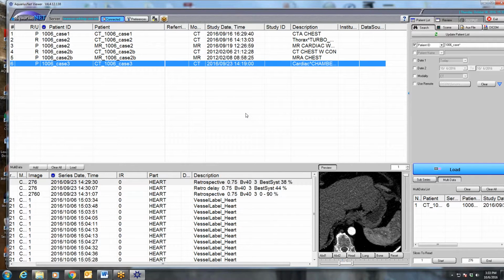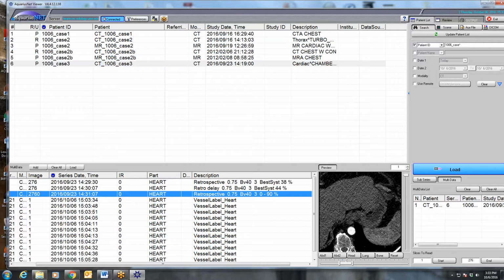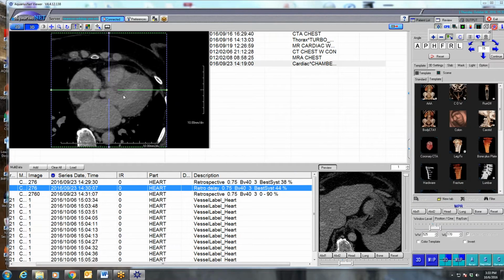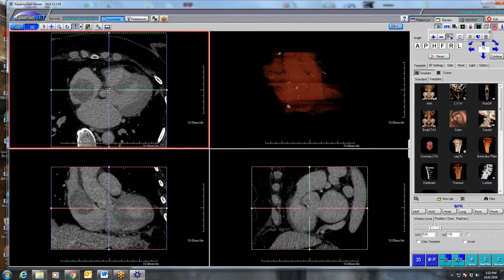That's impressive. It's not really producing much in the way of obstruction. The blood flow is going right around it, down the RA, RV, and so on. Oh, yeah. There was some obstructed SVC flow, I think they saw on echo, but no, there was not.